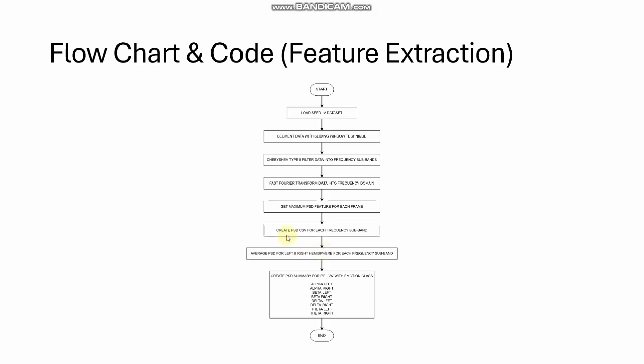After that, I will be accumulating the data from all the 4 CSV and then averaging for the left and the right hemisphere for each of the band. So the final CSV that is expected is a CSV that contains 9 columns.